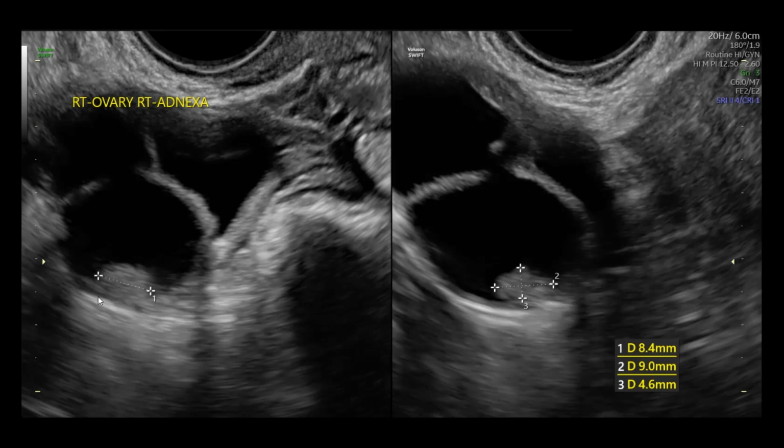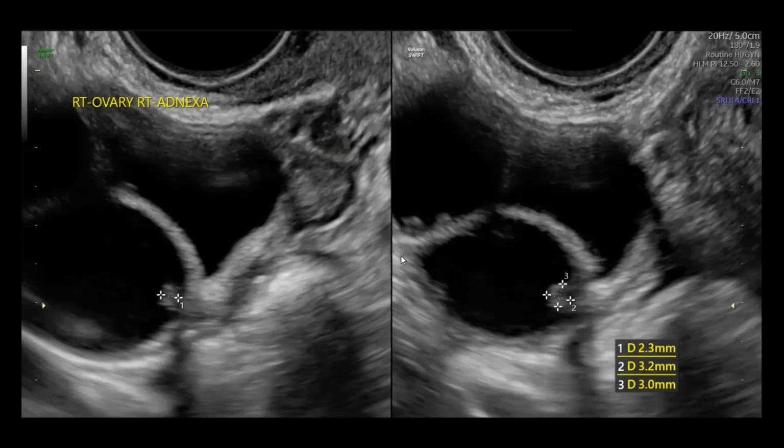That means we're going to see the area behind this papillary projection the same as next door to it. Whereas tissue like calcifications or fibroids or fibroadenomas, these are more dense tissue. These types of tissue generally elicit an acoustic shadow. So we're not seeing that here, which is one of the most important lessons in this particular ovarian mass assessment.